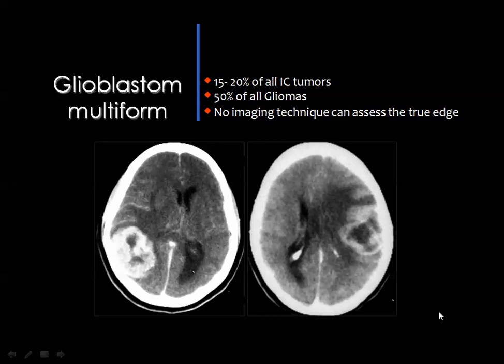You see here a tumor with non-enhancing areas representing intratumoral hemorrhage and necrosis, which are features of this type of glioma. And you can see the extensive perifocal brain edema around the tumor, compressing the lateral ventricle, which is totally collapsed. And there is some displacement of the midline structures, as you can also see here.